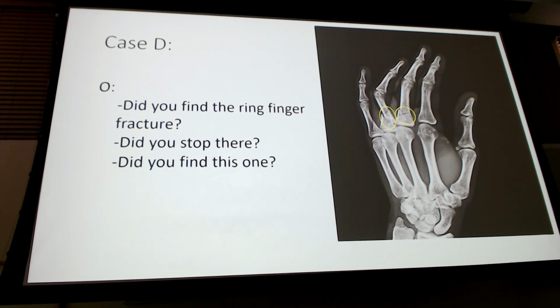What is this line here though? Is that radiopaque or radiolucent? But yeah, I would want more pictures. For those that were asking, he's talking about where I moved the yellow circle, that maybe there's a little bit of a horizontal radiolucent line in here. What's difficult with that, because of the soft tissue shadowing, is we don't know. I want that PA to really look at it, and in real life, you look at those.